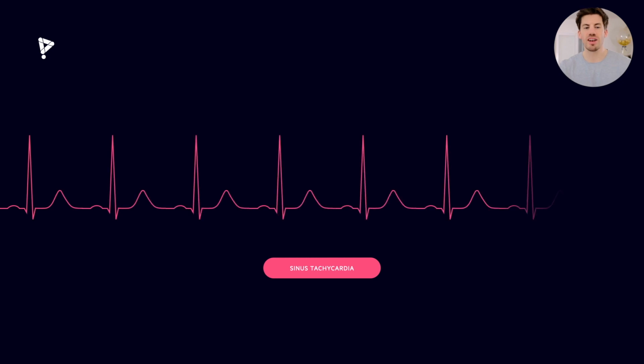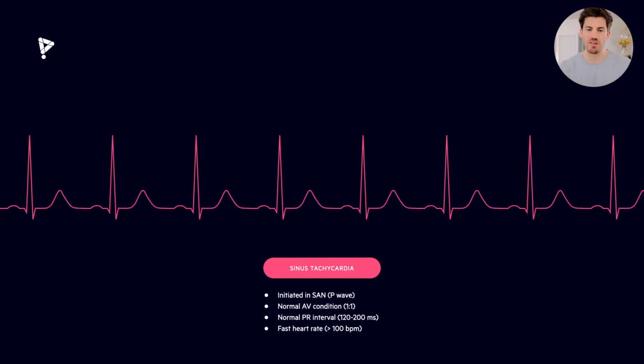In sinus tachycardia, we can see it's much faster, but again, initiated in the sinoatrial node with P waves. There's normal AV conduction with 1-to-1 ratio. There's a normal PR interval, but it's just fast. So this is an example of sinus tachycardia.